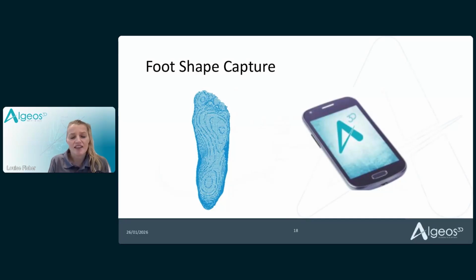This is typically the type of mesh scan that you tend to see from a mobile scanning app. And again, you can see that you have less control of parameters within the foot. So how the forefoot sits in relation to the hindfoot, how plantarflexed the ankle might be, is the forefoot abducted or adducted off the hindfoot. You need to try and control those parameters.